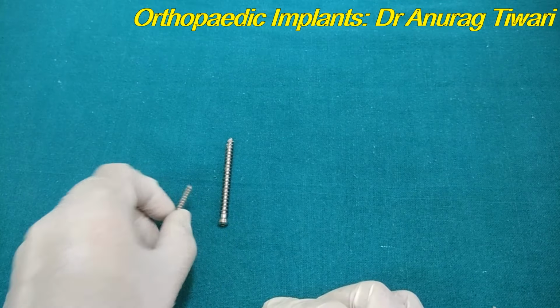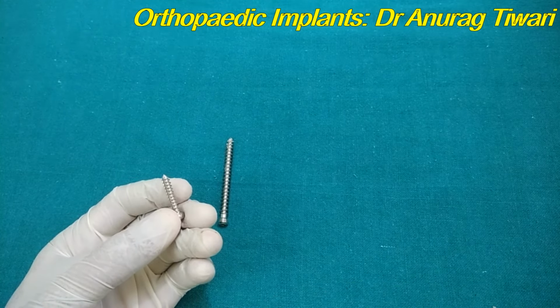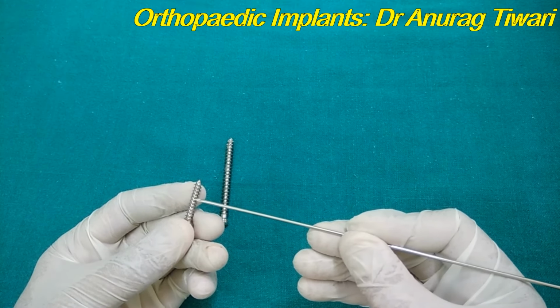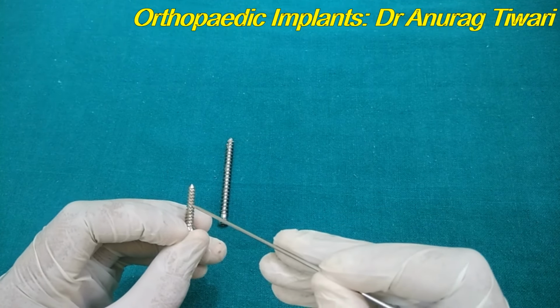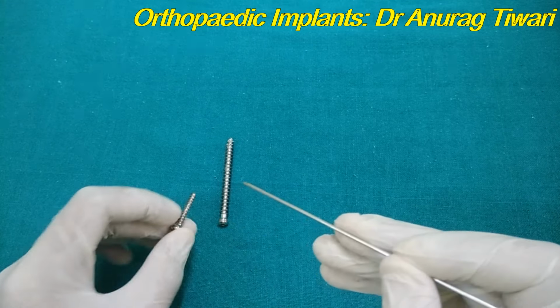The way to differentiate them is based upon the pitch and the thread depth. So if you see carefully, this is the cortical screw. The pitch is actually the distance between the two threads. So the pitch is low, and the thread depth is the depth of the thread from the core diameter. So it is the thread diameter minus the core diameter, or the shaft diameter.